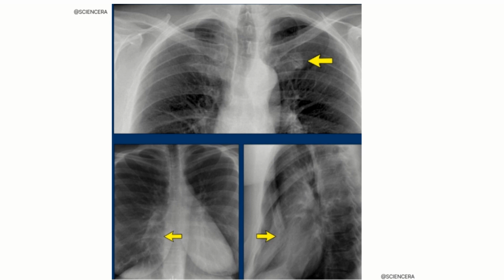The reason the doctor mentions it is that it can look a bit like a mass in the lungs, which could be concerning if they didn't realize it's just an extra joint. But once they recognize what it is, they know that there is nothing to worry about. It's just a variation in different people.